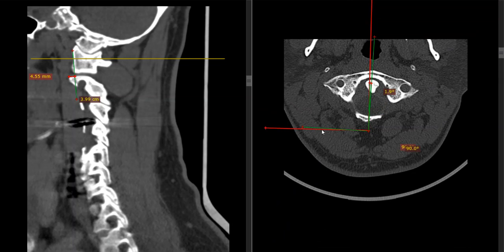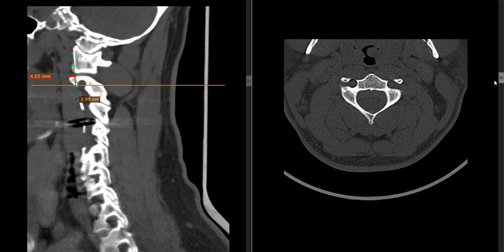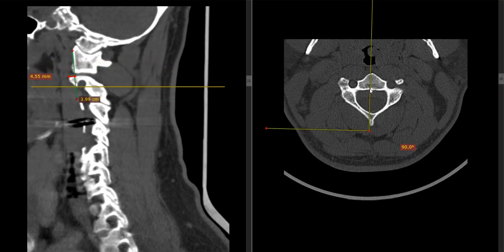Alright, moving on, still at 20 minutes so far. Now we're going to come down to C2, which is actually looking pretty straight. Well, maybe not. I mean, a lot of posterior portions of the spine can actually be pretty mangled looking. So if I'm looking at C2 and just taking a stab at it, this is not me being too meticulous.